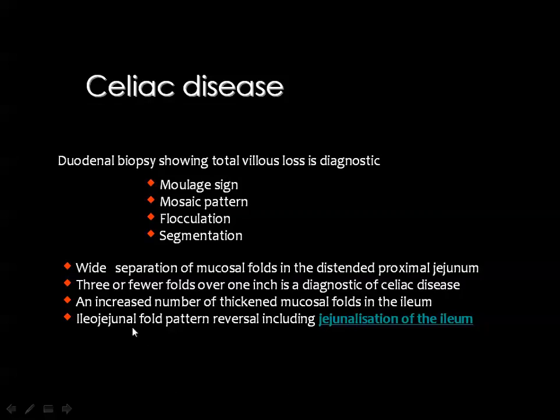with, on the contrary, an increase in the number of the mucosal folds in the ileum, and this is known as jejunalization of the ileum.